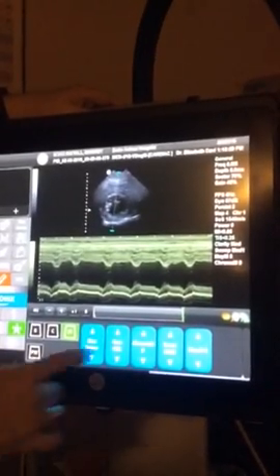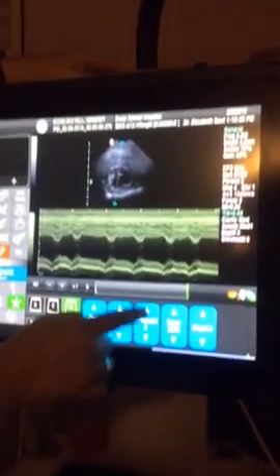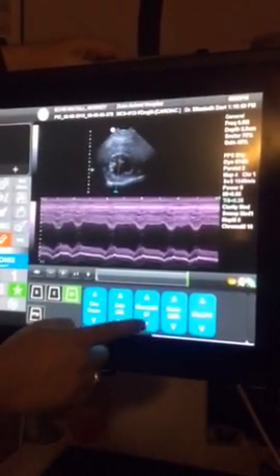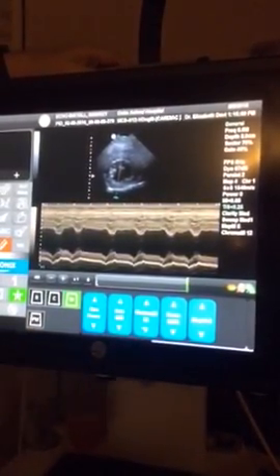I didn't know how they did it. I just saw Chroma M, and I think there's 13 or 14, 16 different nice colors there. So wherever your eyes feel comfortable.